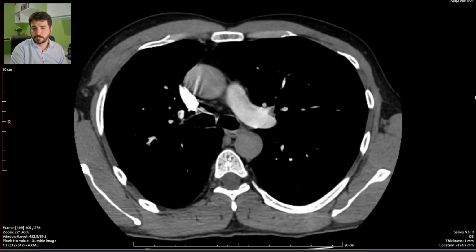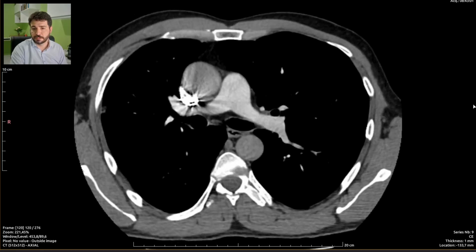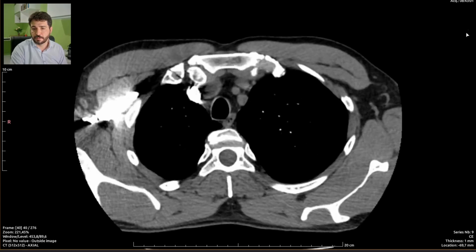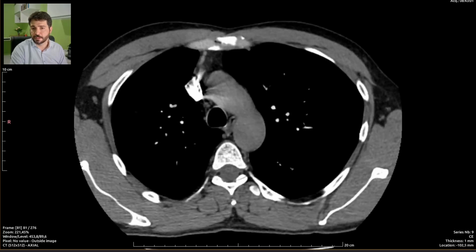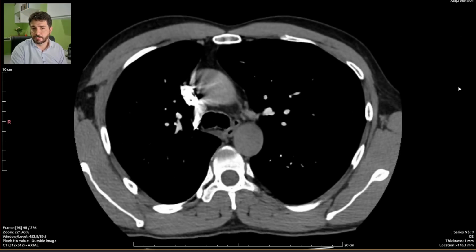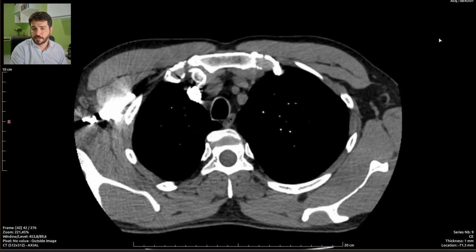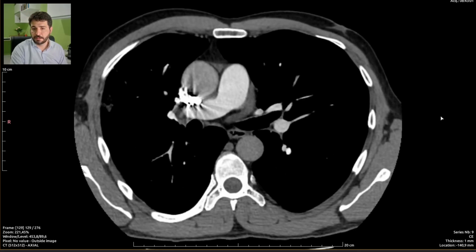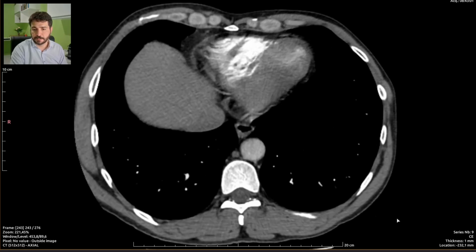Let's roll over the images on the axial view, the original view, the acquisition volume, to see if anything on these bright spots, which are sectional images of the pulmonary branches, have any signs of filling defects.